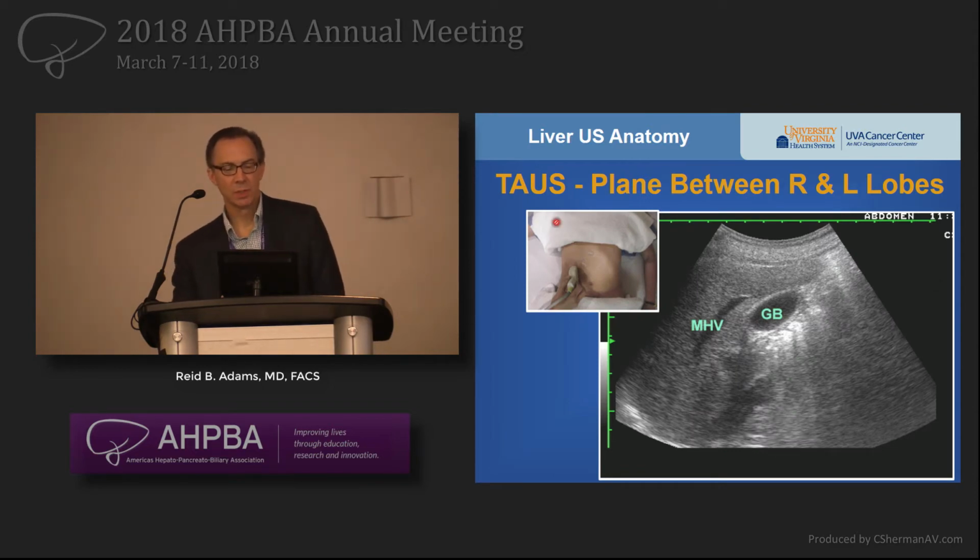The next series of images will have the external image. If you keep an eye on these when we do our ultrasound a little bit later this morning, you can get some sense of how to make these images yourself.